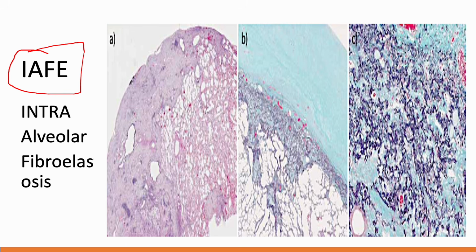of stains. The first one is the HE stain, the second one here is the elastica Masson stain, and this is a high power view of the same, where it may show intraalveolar collagenous fibrosis and elastosis. So, elastosis will be very prominent. It will be more prominent than collagenous fibrosis, and that's how it is seen histopathologically.